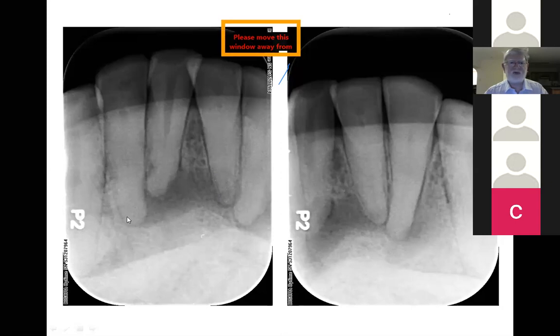We've lost it here, we've lost it there. So this bloke's had maybe 4 years a large lesion, periapical lesions merging, massive area of destruction in the mandible, and something's changed its nature. It's become chronic, and he's in a lot of pain.